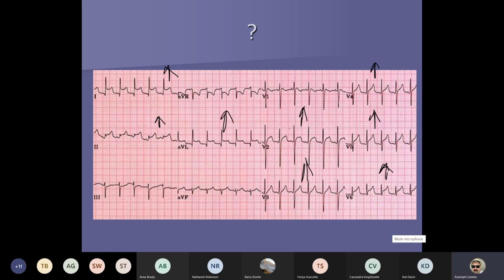All right. Who wants to take a crack at this, and this is something new to you guys, and tell me what they think this is? Because judging off this, which vessels of the heart would be potentially involved? Lateral, anterior, septal. Lateral, anterior, septal, and what else? Part of the inferior too. Part of the inferior, right?